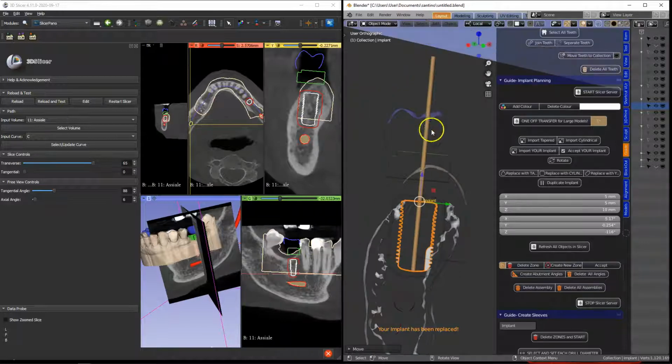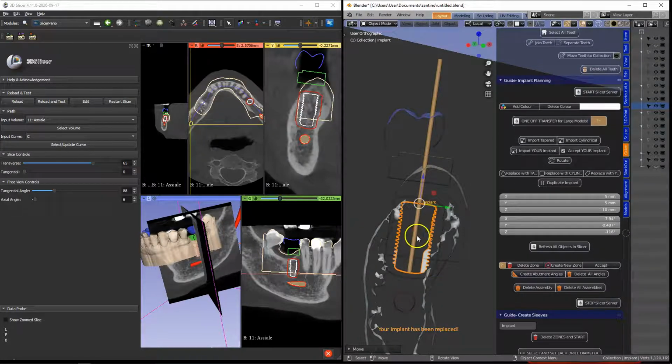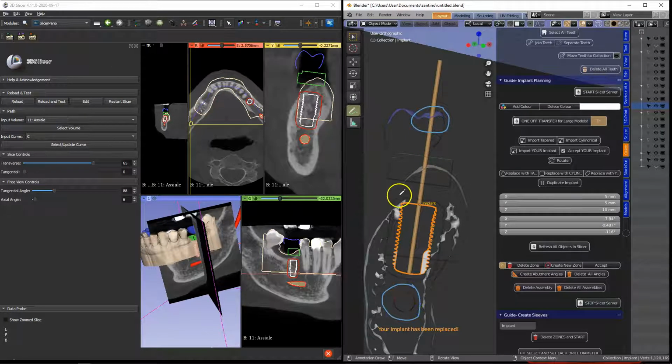Now I'm watching where it's coming out, and I'm also looking at where this nerve is positioned. We want to stay well clear of this specific nerve. So things to look out for are where it comes out, where the nerve is, and basically the width of the actual implant. Let's just clear this away like that.